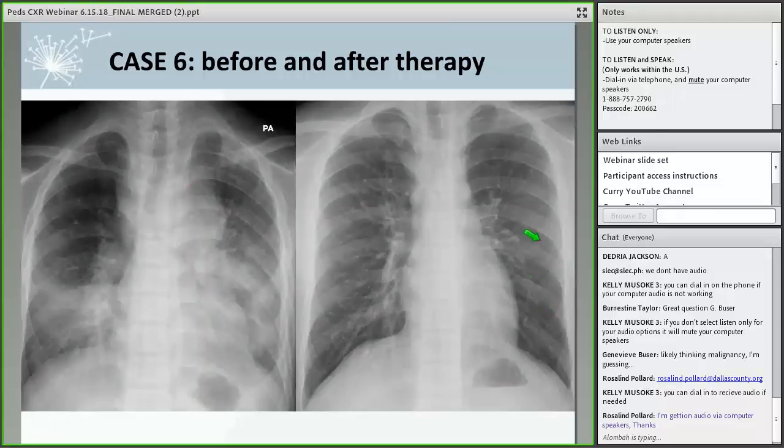And in case I don't say this later, just a reminder that we treated him for a full year. He clearly had disseminated tuberculosis. But oftentimes when we are treating kids for only 6 months, their x-rays are not normal at the end of therapy. Normally it's just the lymph node swelling residua that takes the body a long time to clear out. Sometimes the atelectasis, the obstructive type phenomena. So we treated him for a long time.